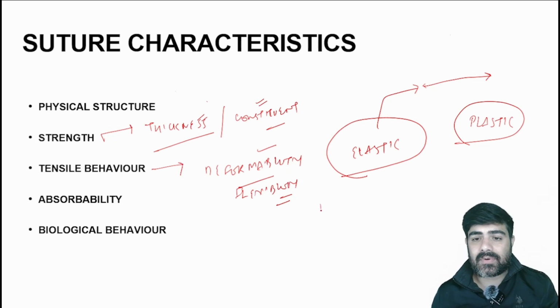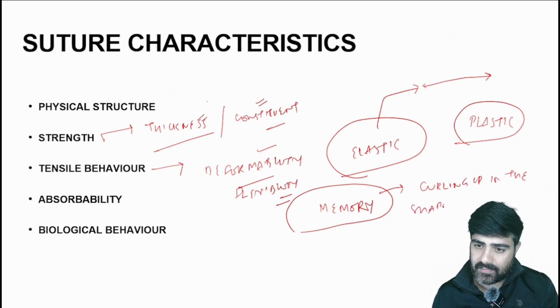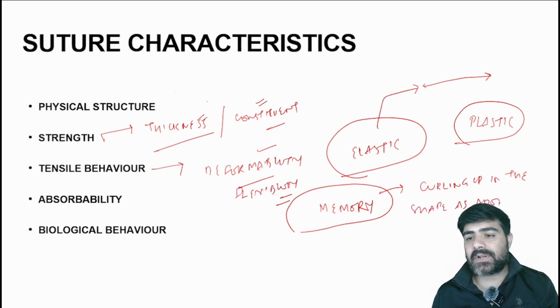And many sutures demonstrate a characteristic that is known as memory, which means curling up in the shape adopted in the package.